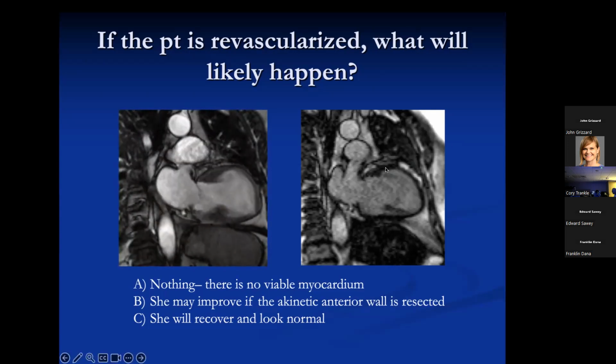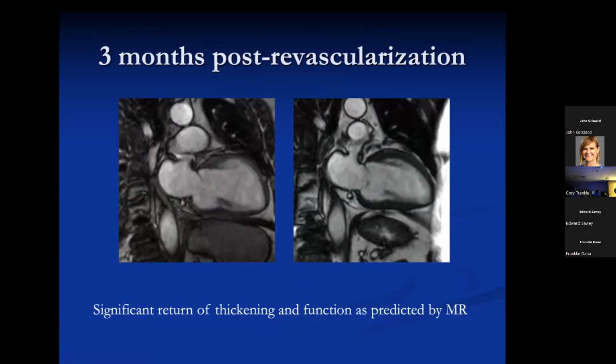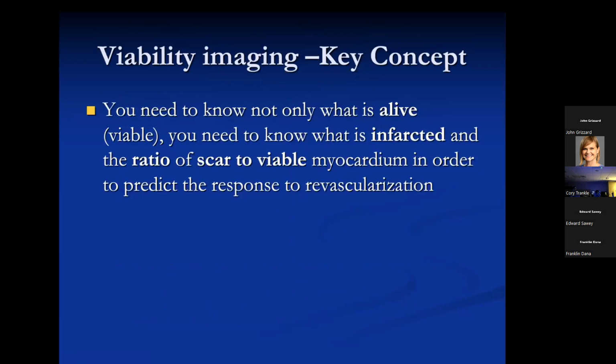Well, the answer is, do you think this is enhancing at all? And certainly it's not greater than 50% enhancing. So you revascularize her, she looks like this. And this is not rare. This happens in not infrequent proportion, but you'll never know.